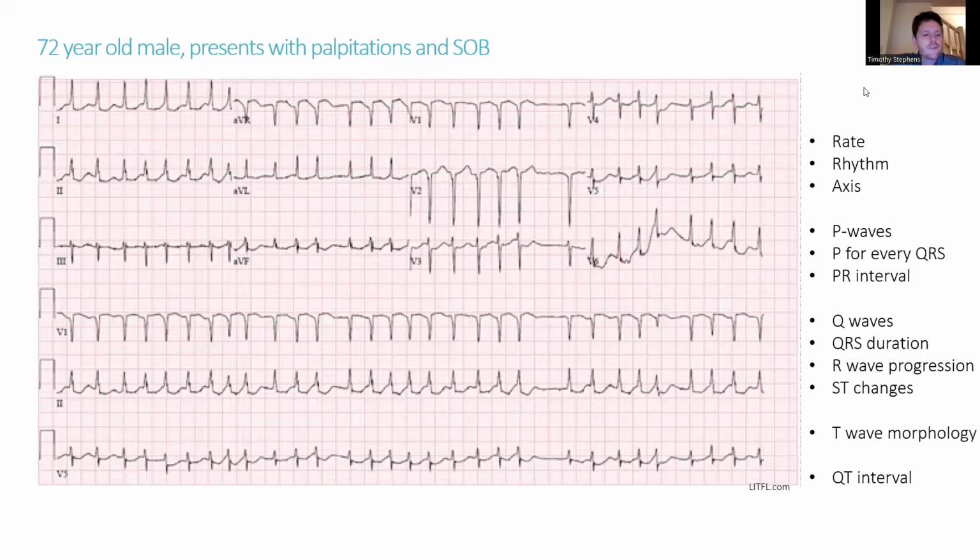This is an opportunity for you to have a go, and we'll talk through the ECG together as you're going through. Okay, no worries. So that's fine. So we'll talk through it together then. But if anybody does want to have a go, please just voice in. All right.